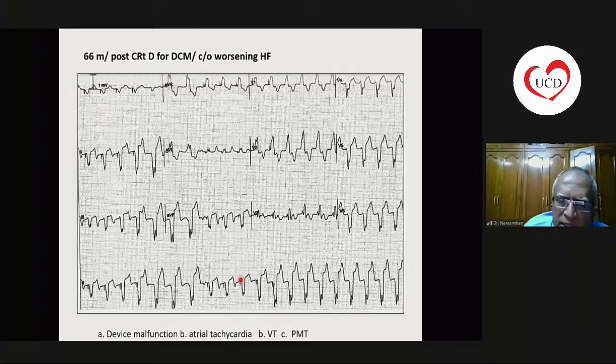So whenever a patient with CRT develops a slow VT, this is very common in India because we keep loading these patients with amio, and the VT doesn't disappear, it just slows down. So when the VT slows down below the rate cutoff of a CRTD, the device will not fire or will not pace to terminate. It will only pace at the LRL or at the upper tracking rate. And whenever this VT is there, it will just present as unexplained heart failure.